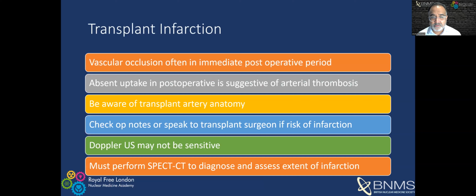Something that's also worth knowing is that the Doppler ultrasound may not be very sensitive in this situation, and you can't rely on that to interpret your renogram. So, for instance, if you think that there might be an infarction, don't be reassured by a normal Doppler ultrasound that was done in the immediate postoperative phase. I think if you are concerned about infarction, you should definitely perform a SPECT CT.